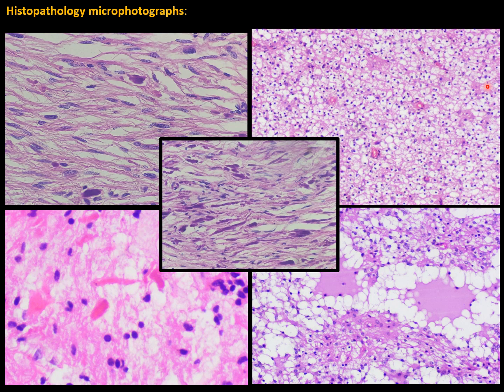And the other pattern is a loose cystic area. The loose areas are edematous and they have this typical microcystic appearance with myxoid material. And there are oligodendrocyte-like areas. Now, one should not mistake this for an oligodendroglioma.